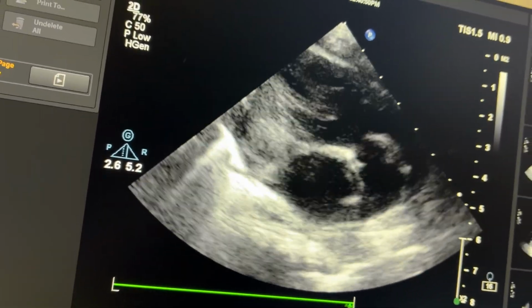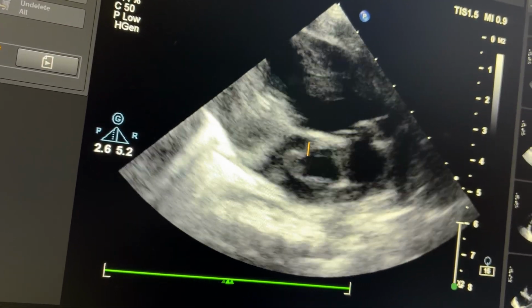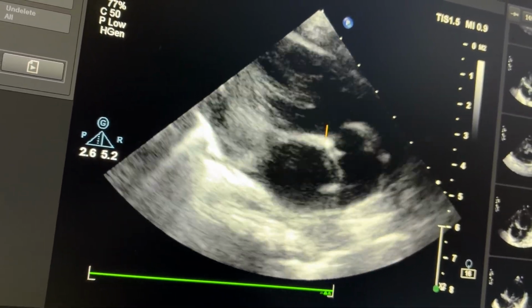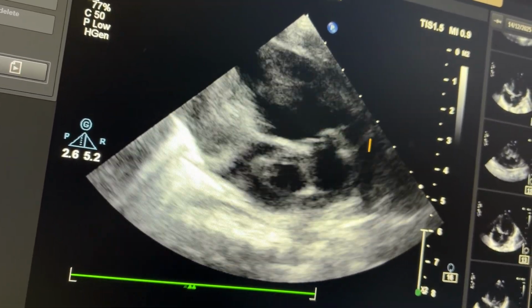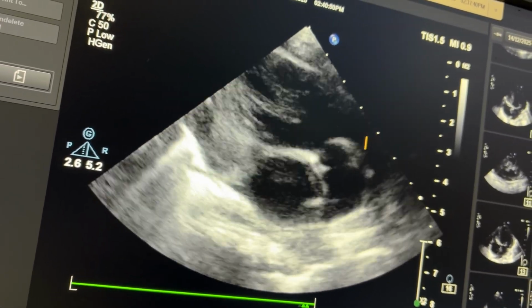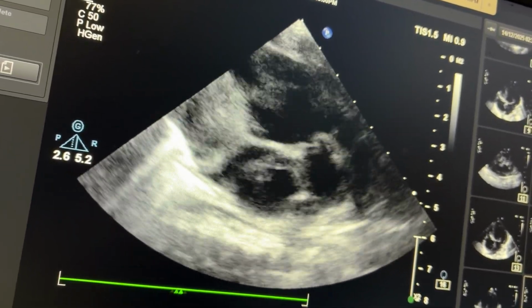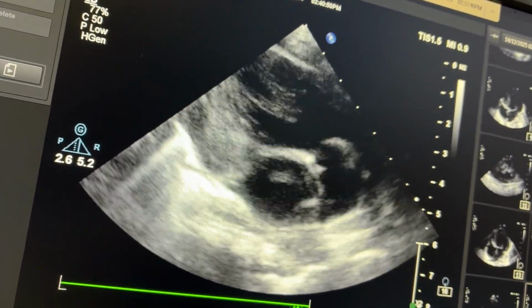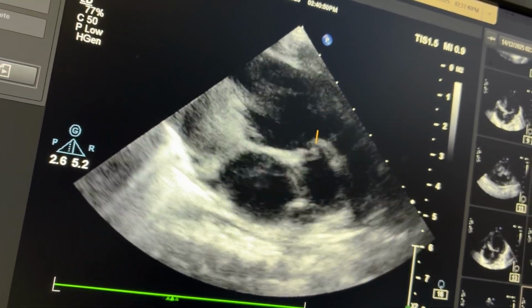In this image, simply remember, flow from right atrium comes into left atrium, then left ventricle to pulmonary artery, and through VSD blood is also coming into right ventricle, from right ventricle to aorta. That is how the circulation is being maintained in this case. So interesting case. Overall, this case is tricuspid atresia, d-transposition, ostium secundum ASD, and this is subpulmonary VSD. That is overall point that we can learn from this video.